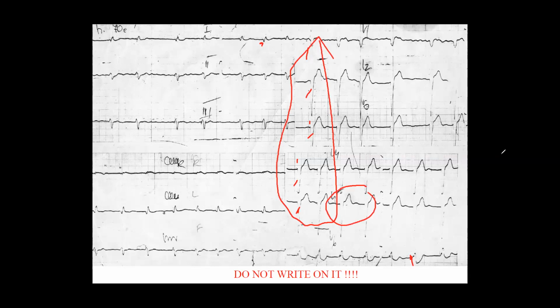So what does it indicate? That's a tricky one. This is what I wanted to show with this ECG tracing.